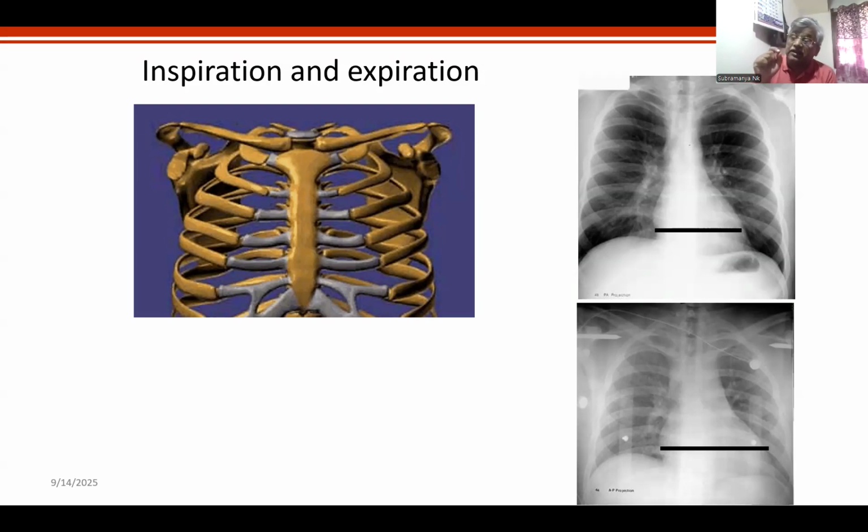I'm coming to a clinical application. These two are important. One, cry, and second, air trapping, which is the most common thing that happens whenever we, as busy practitioners, order an X-ray, and the X-ray often comes in the expiratory phase, or with findings of the expiratory phase, you should know. I'll go further.